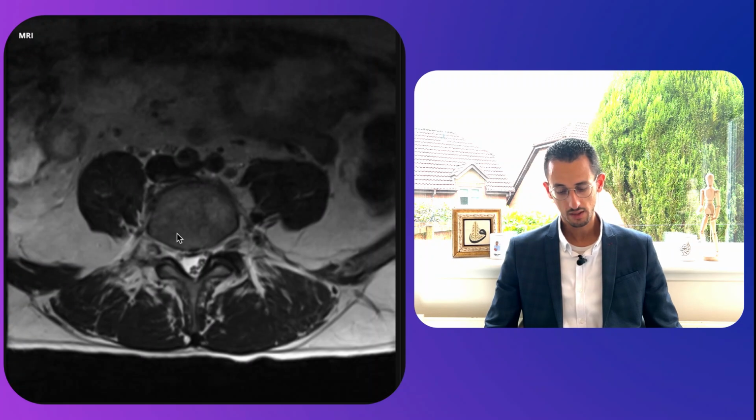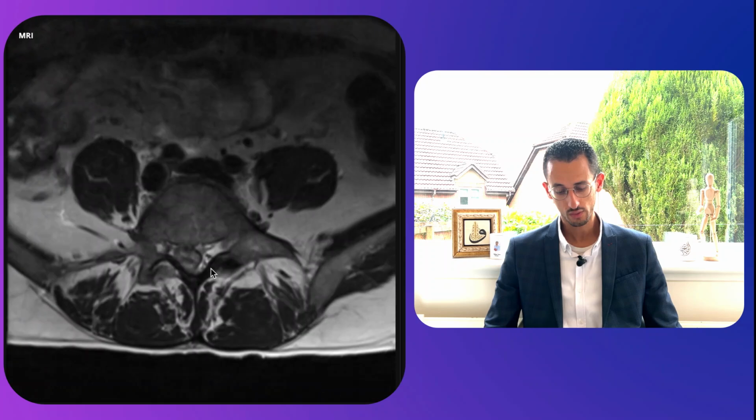If we go from one side to another, again, the nerve roots, teardrop, teardrop. If we go to the other side, again, teardrop and teardrop. And that's, again, a migrating disc prolapse at L4-5. Let's have a look on the T2. Again, if we look here, boom, that's on the right side, causing pressure and pushing the thecal sac. You can see the nerve roots, the dots are crowded towards the left side, and that's a right-sided disc prolapse.